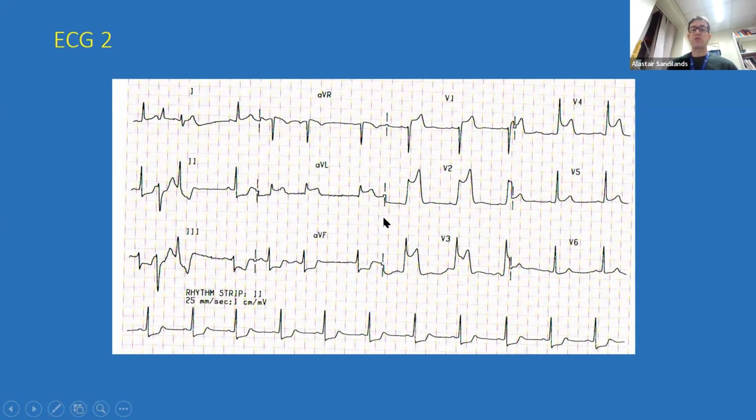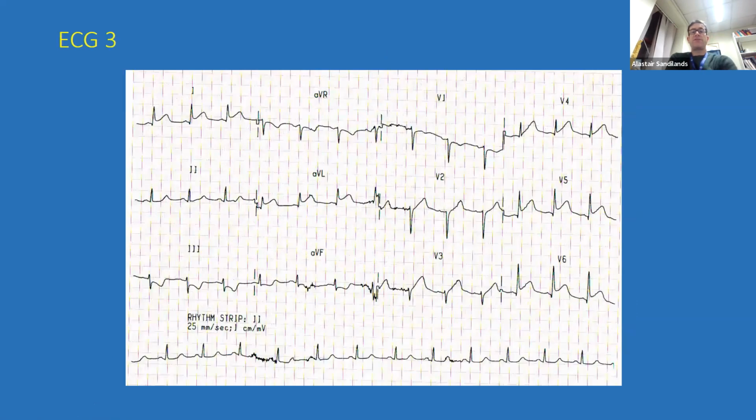The diagnosis here would be an anterolateral STEMI with inferior reciprocal changes. That would get you all the marks in an exam. I don't think we'd expect the ectopics as well, but okay, any questions on that one? So this would be the left anterior descending artery, most likely. Okay, have a look at this one, please.